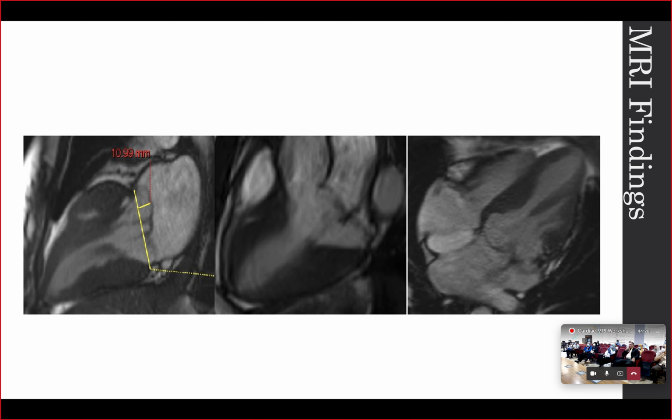And on the static images, this is 2-chamber view, left atrium, left ventricle. Yes, there is some hypertrophy in the basal, and the basal cuts were hyperdynamic compared to the apical segments. But there is a mitral valve prolapse of both leaflets. And here is the jet of the mitral regurgitation. Again, the jet of the mitral regurgitation, as you may see here, is clear the mitral valve prolapse.